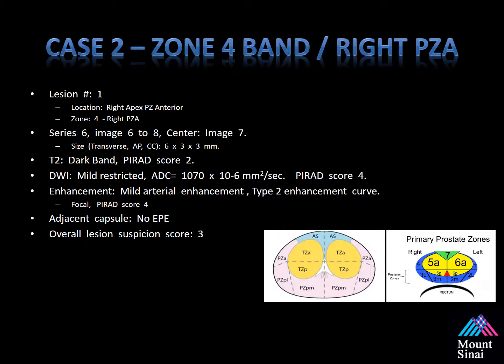Please take a moment to appreciate the PIRADS 2 zonal anatomy. I think this is extremely helpful. Once you get used to this, you're able to scroll through an image and find the exact area of suspicion that the radiologist is trying to lead you to.